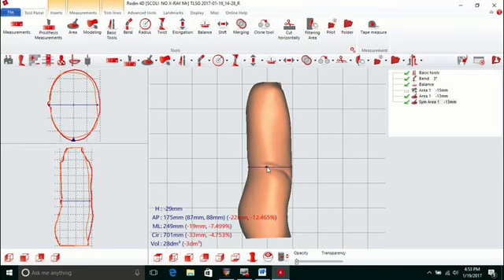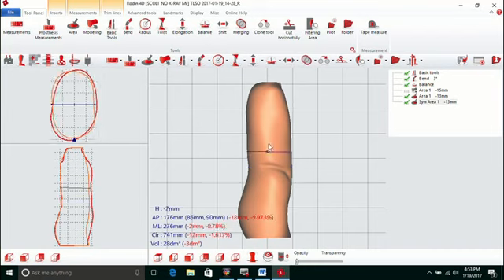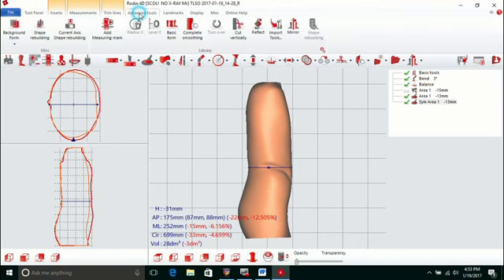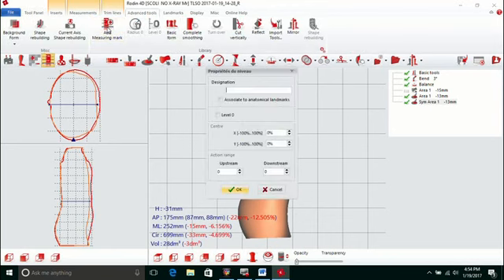Now, if you have an order form or you have measurements and you want to put measurements and apply them to your model, we need to apply the measure marks. So what we do is cursor line, place it where you want to put your measure mark. Top menu line, Advanced Tools, Add Measure Mark.